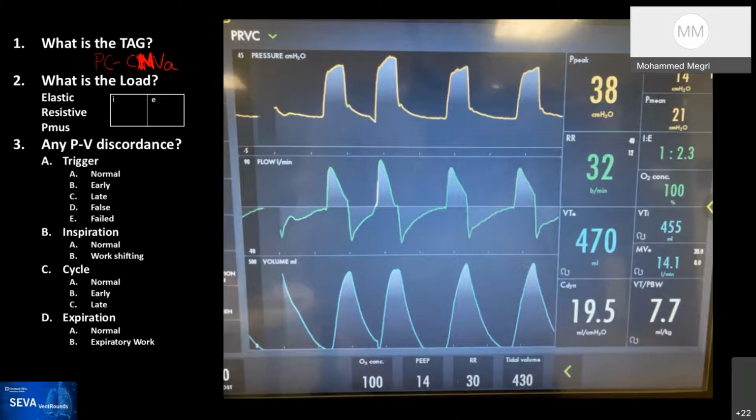Why I said that: looking at the flow, the flow is not fixed, and most of the breaths were not triggered by the patient except for the second breath. The volumes have been increasing steadily from the first breath. I don't know if the machine was trying to see, after the patient's effort, what support it needs to give to reach the tidal volume set by the operator.